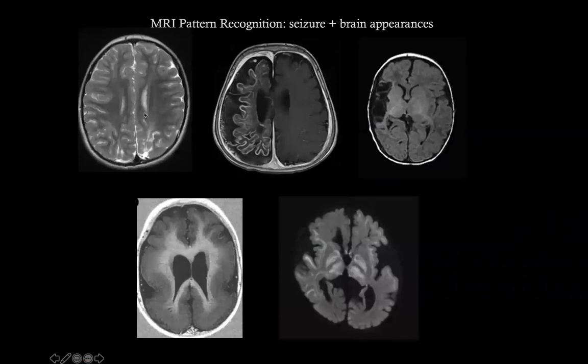Of course, you can have a lot of other causes of seizure, and these are several different cases. So you can have an insult here. So this was hypoglycemia. So you can see the oligemic appearance of the cortex. This is an insult, an ischemia basically at birth. This is Sturge-Weber. This is an MCA infarct at birth. So that creates this hole with gliosis that can give you seizure. This is lissencephaly, so a genetic cause. There is nothing to do.